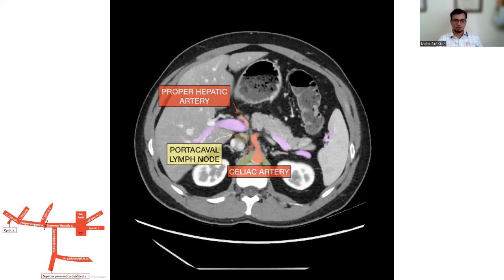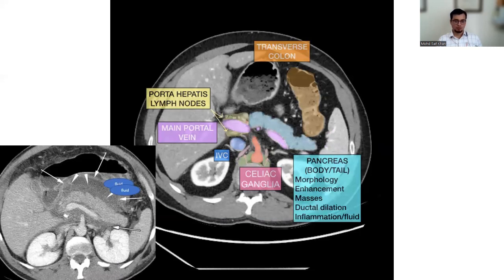Now look at the branch of the aorta appearing here, the first branch, which is the celiac trunk arising from the aorta, and it is going to divide into the hepatic artery and splenic artery. Here you may see the porta hepatis, or hilum of the liver, which contains, from posterior to anterior, the portal vein, hepatic arteries, and the hepatic ducts, and some lymph nodes.